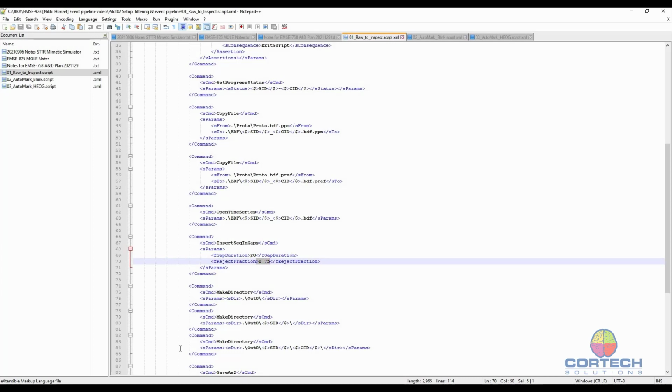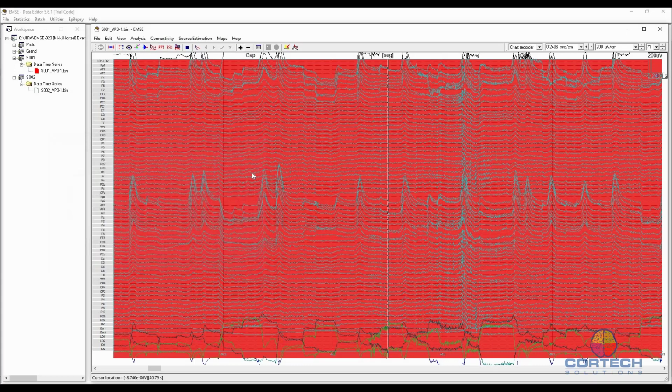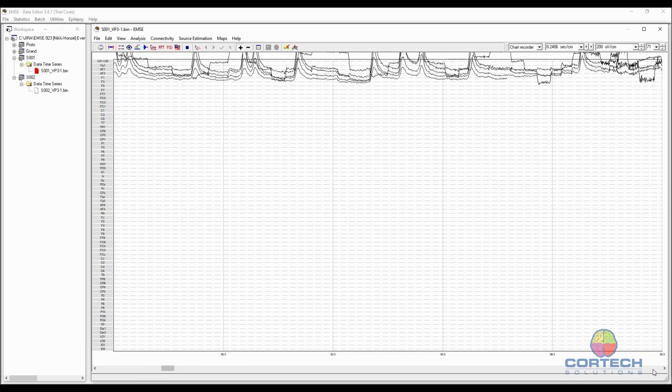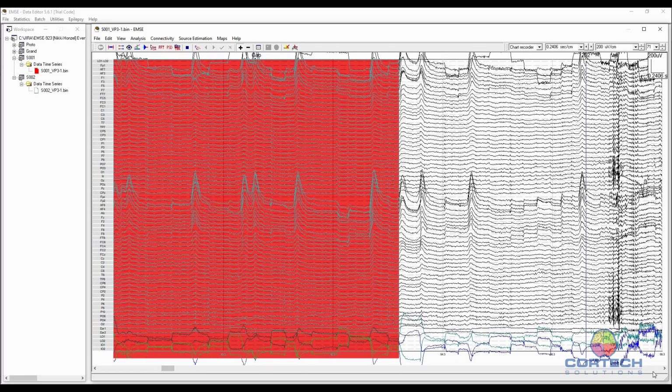And you can see that that's usually a pretty good rule of thumb, unless you're doing ongoing EEG, where this wouldn't be appropriate. But in an event-related experiment, notice here it automatically marked this big gap between events, and you can see it looks like there was a pause of some sort there, and there's a lot of ocular activity. So that was automatically marked in this case.